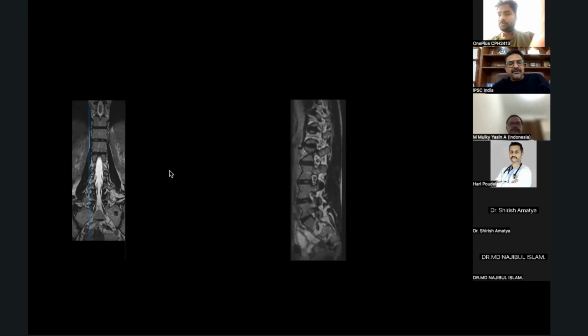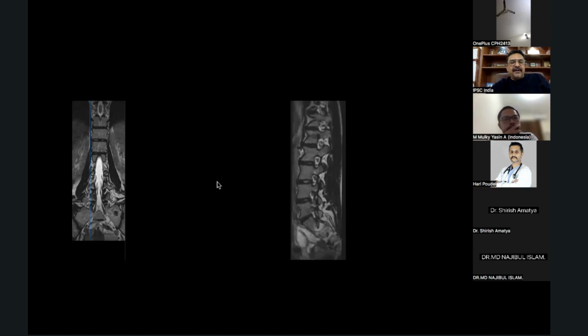So if there is a foramen herniation, you may be able to see it over here in this section. As we go more medially, you can see all these exiting roots over here, and the disc is not bulging, it is not coming into the foramen area. The foramen is completely free. So this also gives you the idea that you have good enough space available to enter into the foramen, where your exiting root lies, and how safely you can go inside.